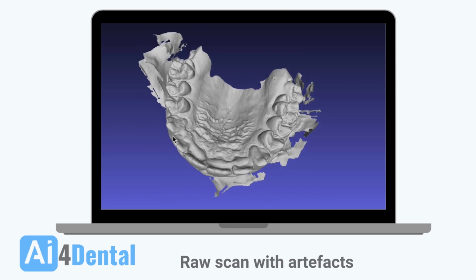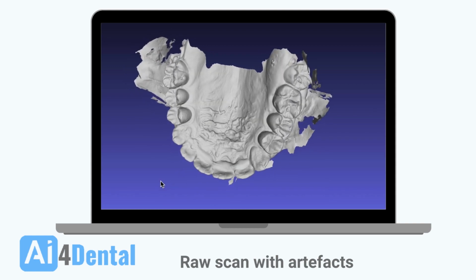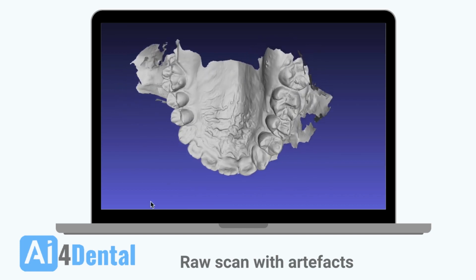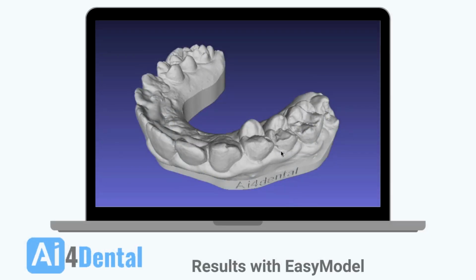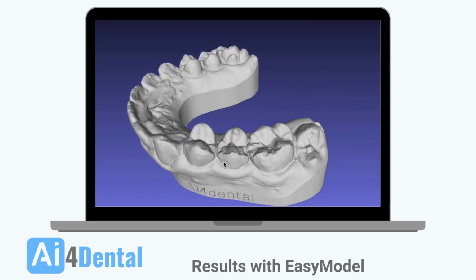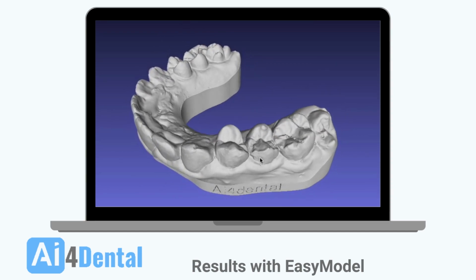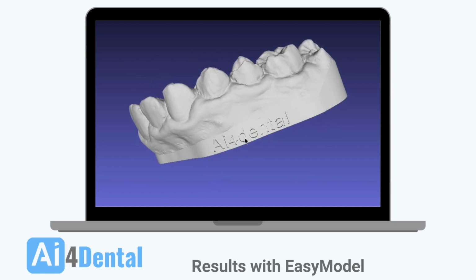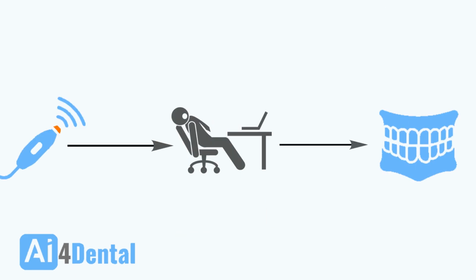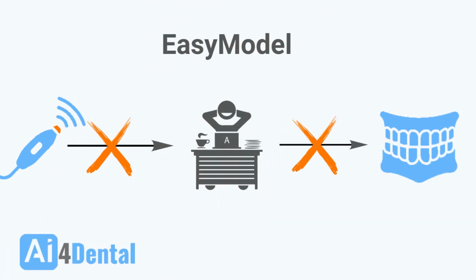At AI for Dental, we know how tedious and time-consuming this can be, especially when you start from scans with so many artifacts. That's why we created EasyModel, an artificial intelligence-based tool that automates these tasks to make the model you want from raw scans. You can then finally focus on your job as a prosthetist with high value-added tasks. So let me introduce you to EasyModel, the tool that will change the way you work.